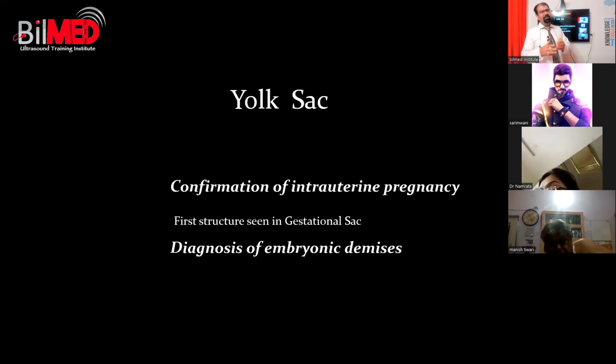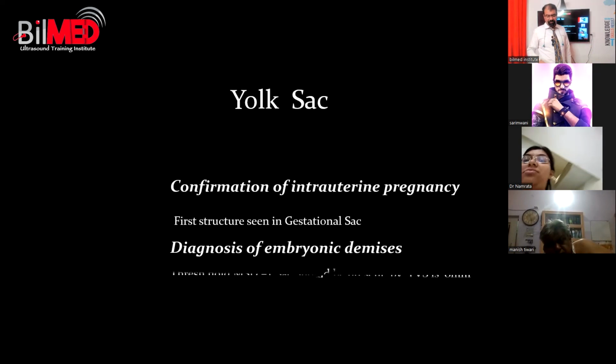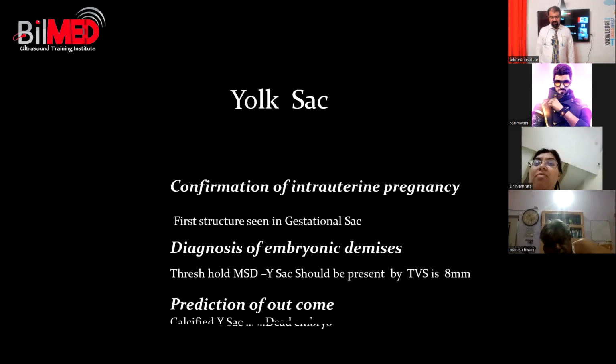So as already said, it is the first structure, and at times it diagnoses the embryonic demise. How? If you are dealing with a very abnormal yolk sac, what is abnormal? We will come to that. It means that you are dealing with a dead fetus. In 99.9% of cases, the fetus will not have fetal cardiac activity. So this is the yolk sac's importance.